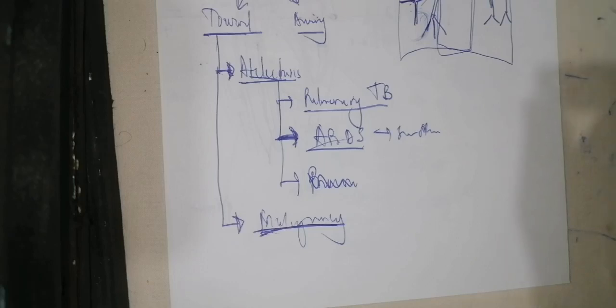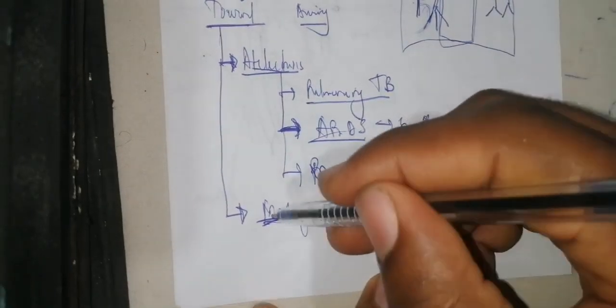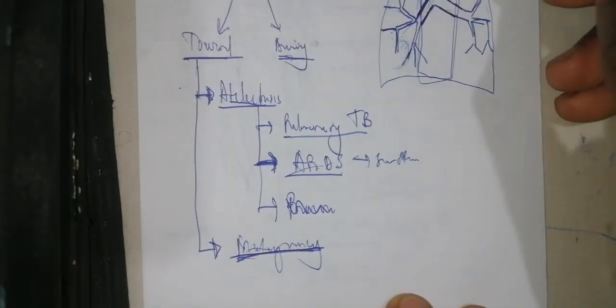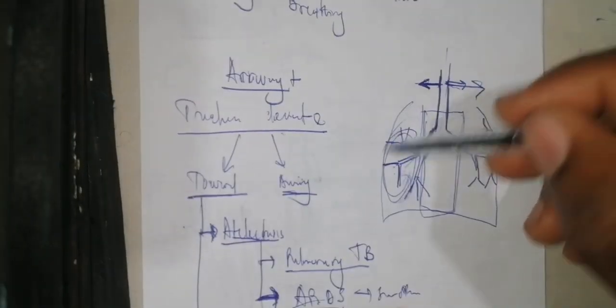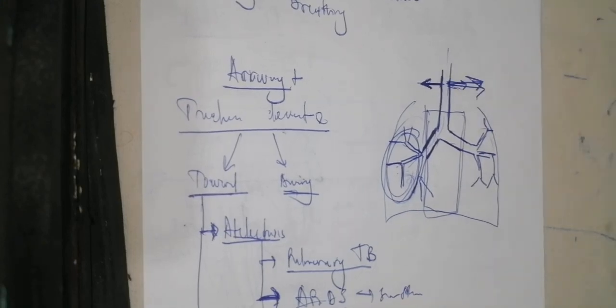White, associated mostly with tuberculosis, and you have also family history of lung cancers. Now, after visualizing the malignancy, you need to know that you have a patient that it can deviate also. Let's say the lesion is here, but it's deviating like that. It's deviating away from the affected side. It means that it's deviating away from the affected side.